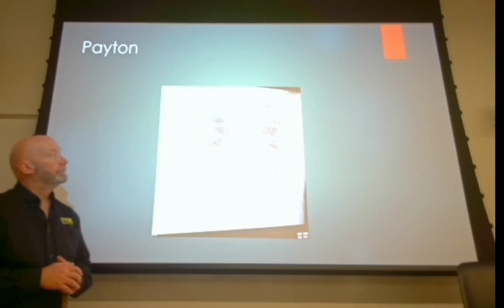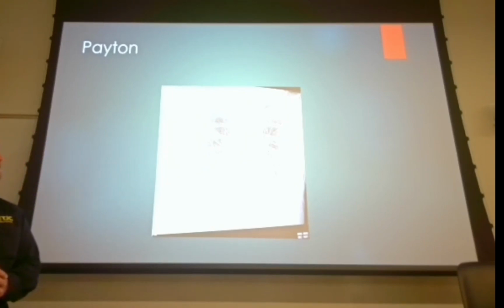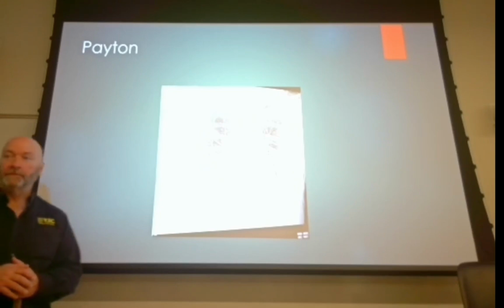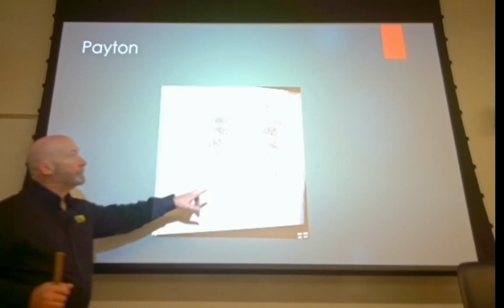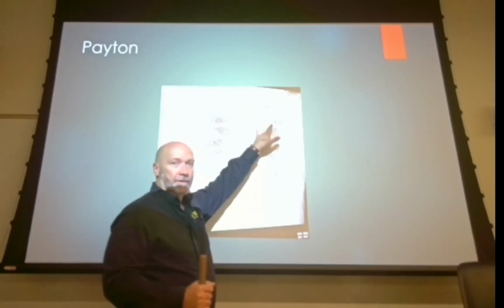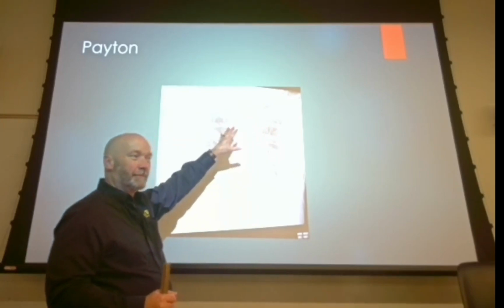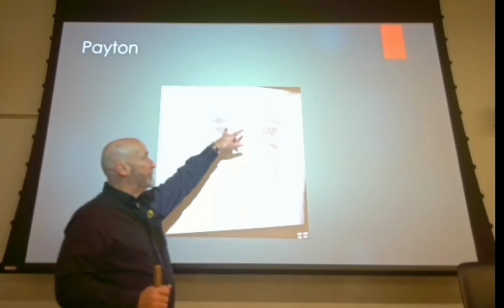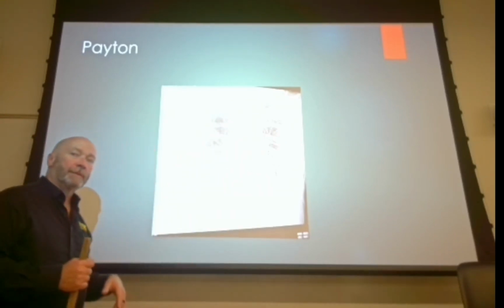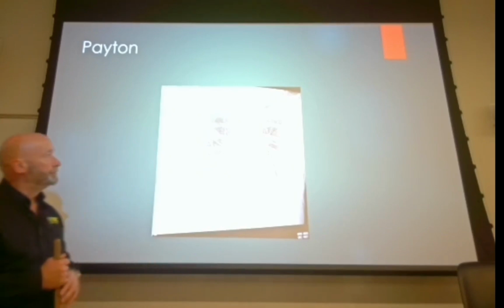Anything else? A little bit of rotation. There's some rotation present, and the patient's leaning. Of those three, the patient leaning is less important. The leaning may be in part causing the rotation, though. Everything kind of works off of everything else. Patient may be kind of cocked up on one hip or the other.